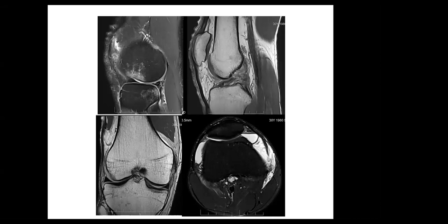Bone marrow edema at the femoral and tibial portion posteriorly, and anterior portion of the femur. Mild joint effusion.